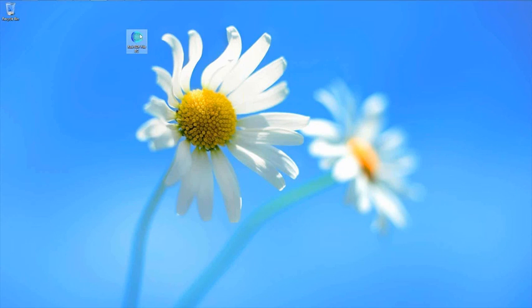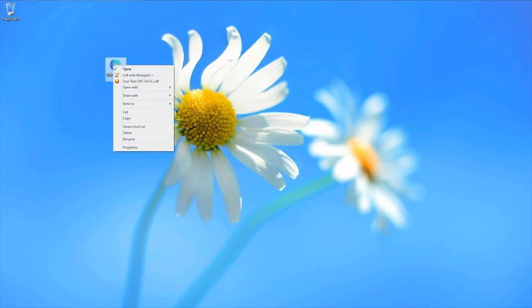Another way is actually opening up the EDF file directly, which I have my file right here. And you're going to notice it has a blue brain just like the BrainAvatar software. That is because you can make it so that the software recognizes it. And the easiest way to do that is to find your EDF file that you want, and you're going to right-click. You're going to choose the option Open With. You're usually not going to see BrainMaster Avatar right off the bat, but you're going to go to Choose Default Programs.